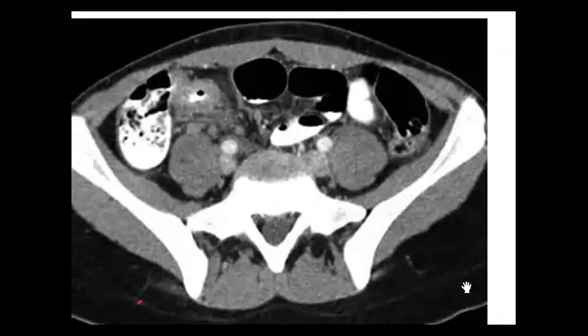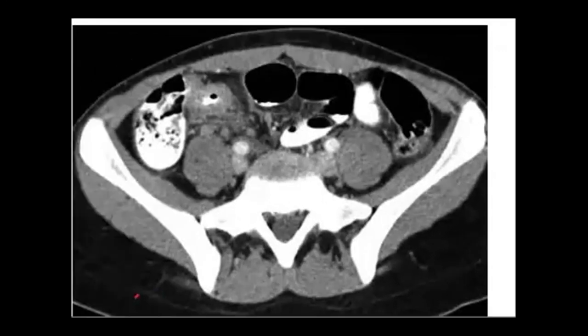And you will search for any focal thickening or enhancement. And if you mention inflammatory bowel disease as one of the causes, search for something called skip lesions in Crohn's, for example. So you will go and search for any skip or similar lesions. Okay. And finally, maybe you'd like to check the sacroiliac joint in the bone window and see if this patient has any sacroiliitis. So it will be important in this case to mention it, either positive or negative.